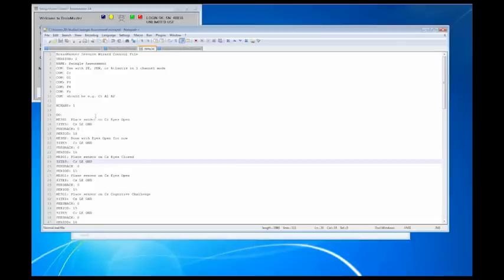Another person, Gary Ames, actually designed a little Excel sheet that will help basically also take this information and kind of be a deducer with it. He worked with Dr. Swingle. He went over all the different things and what certain readings and all that mean out of it. But basically, it does the same thing. I'm going to go over a couple points of it so that you guys understand kind of what's going on with it and why it's doing it.